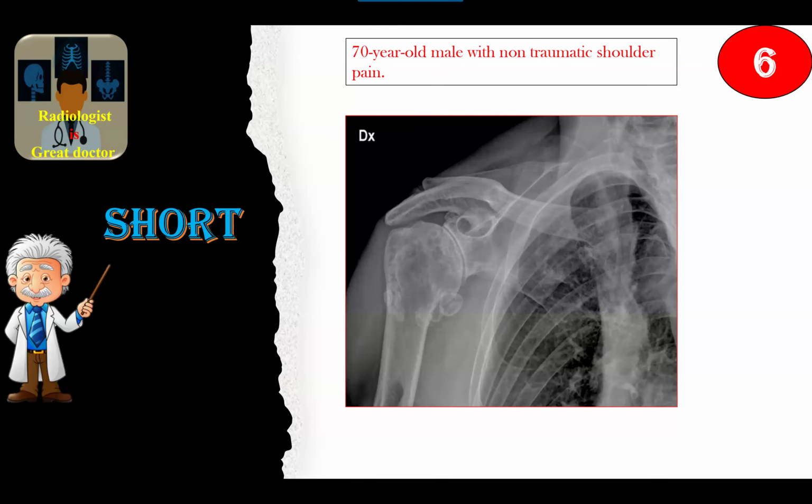In the visualized lung fields I have suspicion of some opacity, which I would like to confirm on the complete chest view, or previous history, or previous radiograph if available, or I will advise a complete chest radiograph for this. Also, complete the study by maybe MRI for superior assessment. Very good.